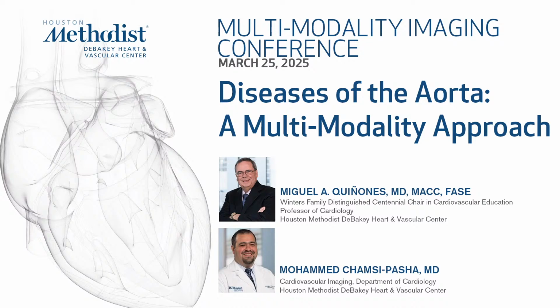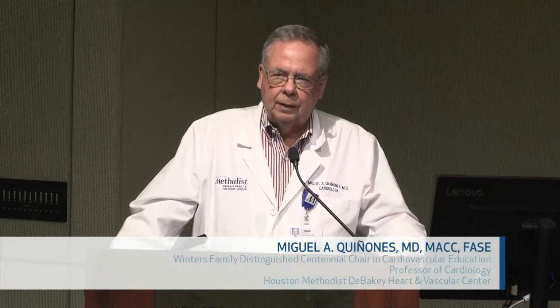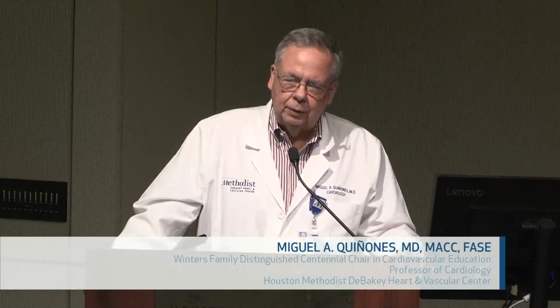I'm Miguel Quinones, and today we're going to discuss the diseases of the aorta. And the imaging of the aorta currently has become exquisitely well done by CT and MRI. Ultrasound still plays a role, but it's more limited. So we're going to start our conference first with a discussion of the role of CT and MRI.